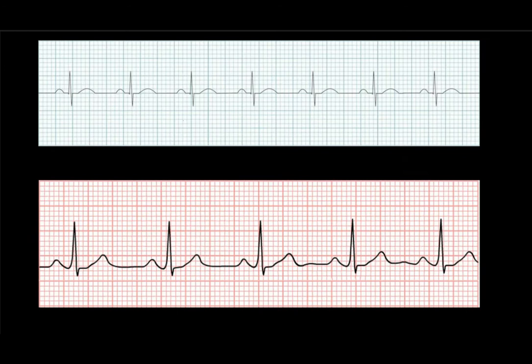Are P waves present or absent? There's no maybe. It's either yes or no. Either they're present or they're absent. And if they are present, are they regular or irregular? Now, we'll get back into a little bit of that. Is it regularly irregular, irregularly irregular, or occasionally irregular once we look at some of those areas, and we can help identify what I mean by that.